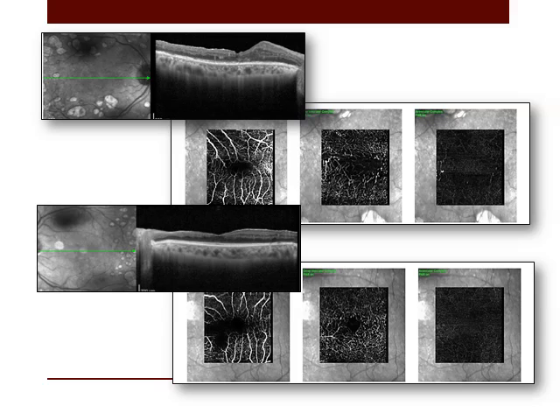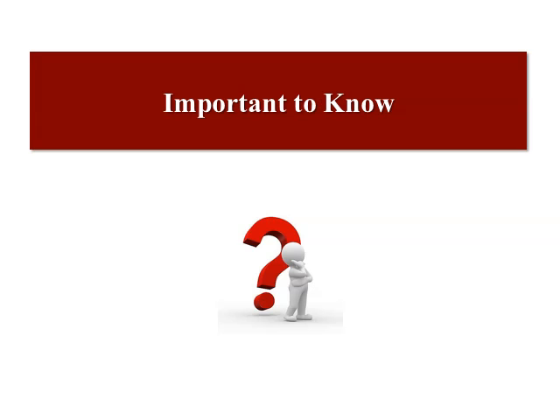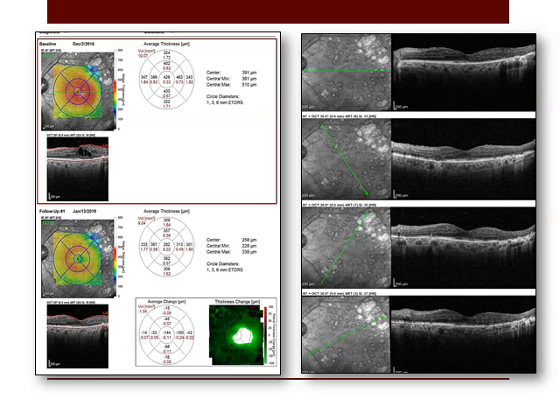So, OCT angiography can help you in the patient complaint. Important to know, any patient with laser therapy, previous macular laser therapy, the follow-up is definitely with OCT. You can't follow up with fluorescein angiography. Why? Because all these laser marks will give you hyperfluorescence. Fluorescein angiography will give you a false positive result for the presence of leakage while it is staining. So OCT should be performed especially for this.